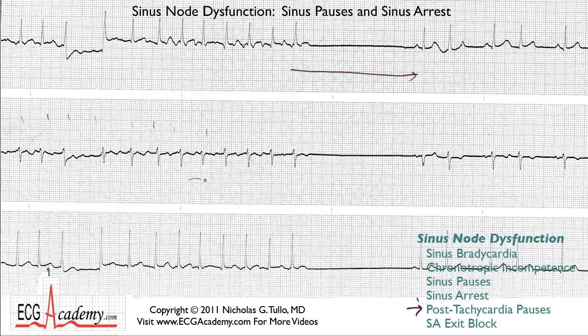It's actually looking about 150 beats per minute at parts. These are 2 boxes apart. And then it kind of slows down on this side. And what you have here is a pause with a very flat segment. Now, you might even think that maybe this is one of those make or break artifacts.